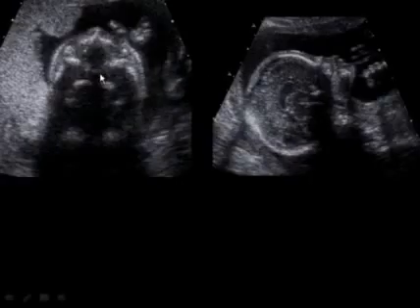Here's another patient, again, looking for the orbits. This is the axial view of the head, and this is the region of the orbits, but we do not have the well-defined bony structure of the orbits on either side, and the nose is very flattened. And on this profile view of the fetus, you can see the chin and the lips, and notice that the nose is completely absent in this fetus.